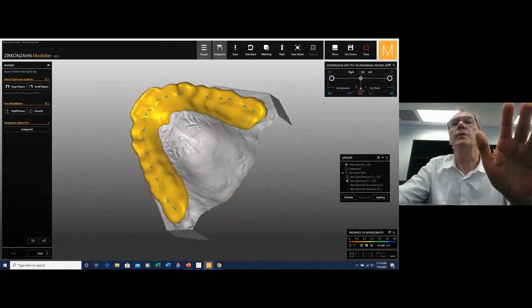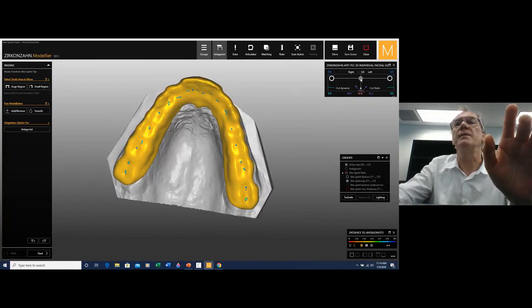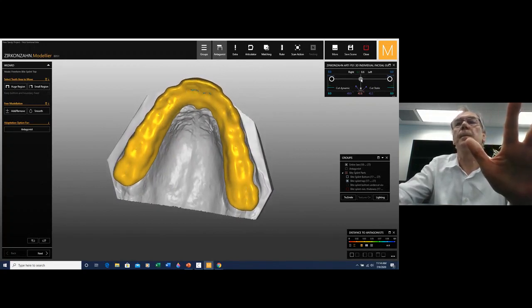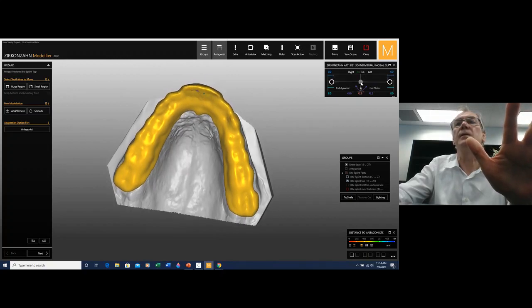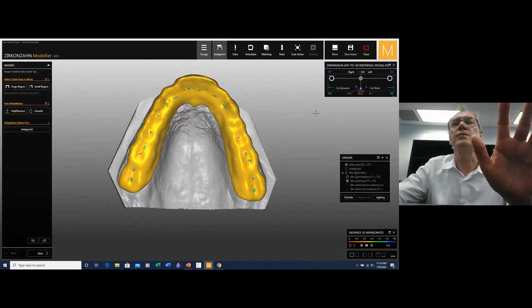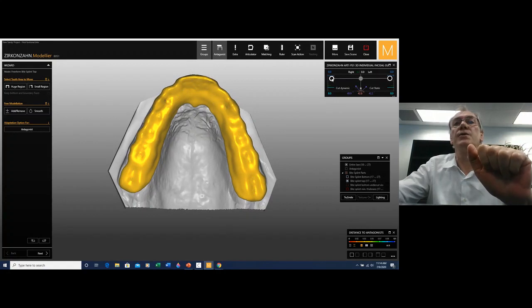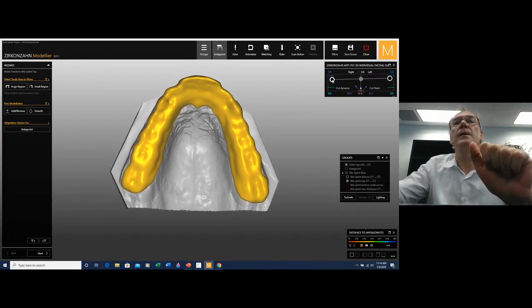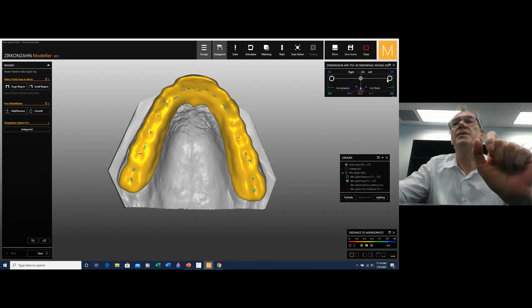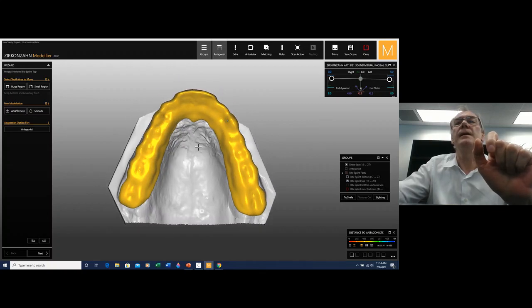Now, we are going to be doing some ortho, so I'm going to try and change the anterior arch in order to get the ideal protrusive movement of this patient. So during the period that he'll be wearing this bite, he'll start getting used to these movements, and we will have the opportunity to evaluate if there are going to be any issues in relation to the TMJ. Our lateral movements need to work like a Swiss clock. The canine needs to take the load, and everything on the posterior teeth needs to be discluded. And the same thing happens here. As you can see, the canine takes the load.